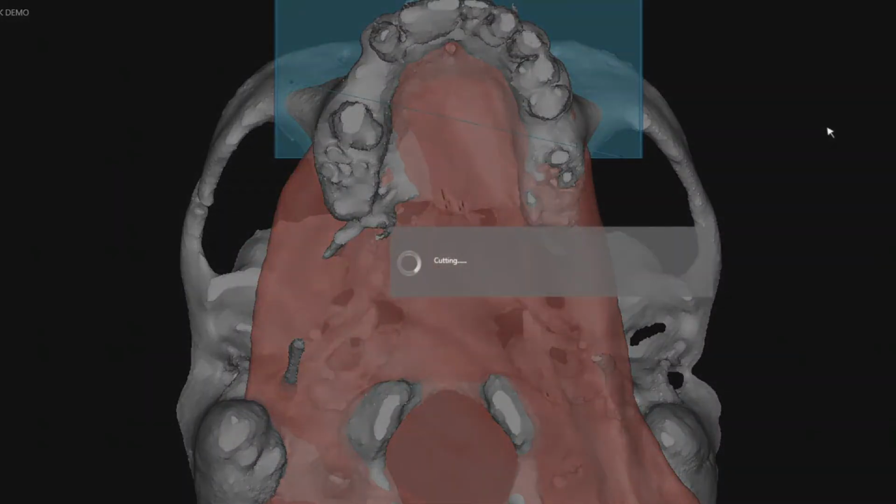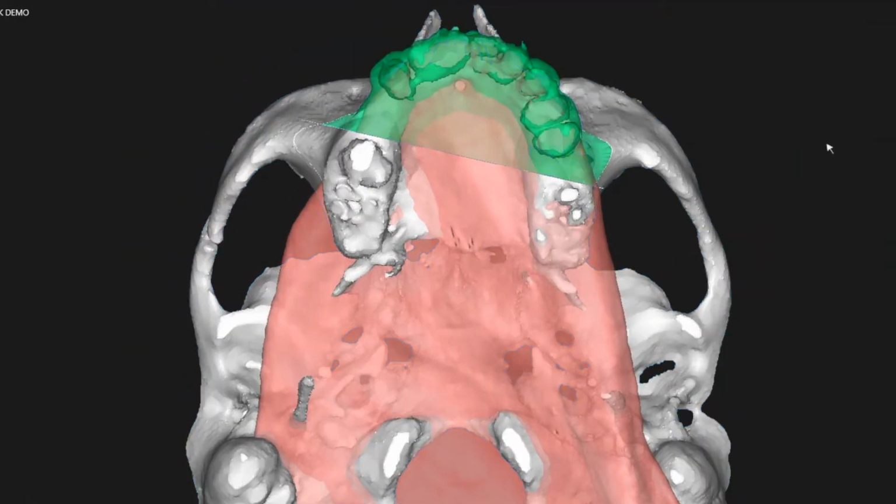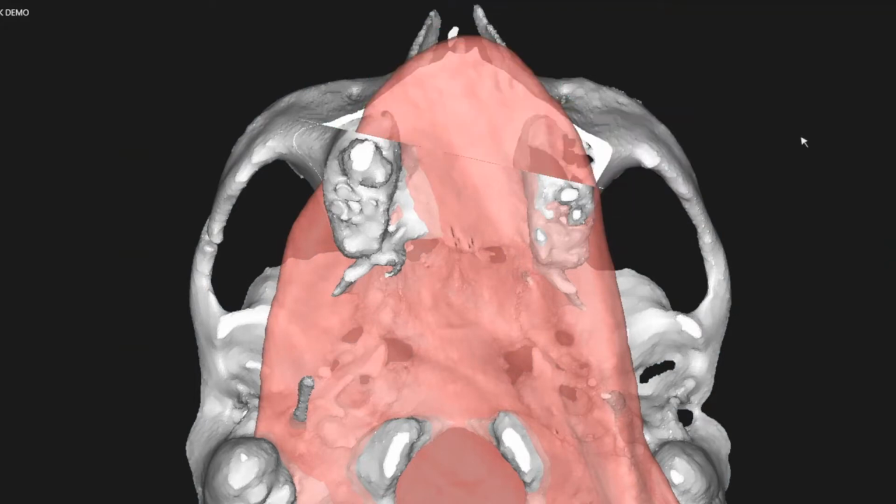The reason for that is just so we've got more bone. The bone of the scapular tip is quite thin, and if we go further back, we get a thicker bone stock. So for implants, that's why I'm taking it further back. Okay, that's good.